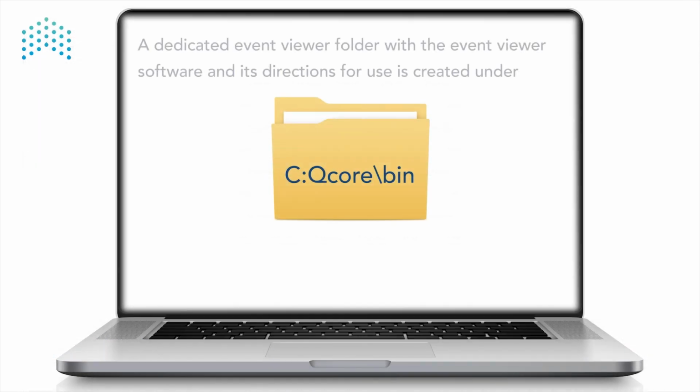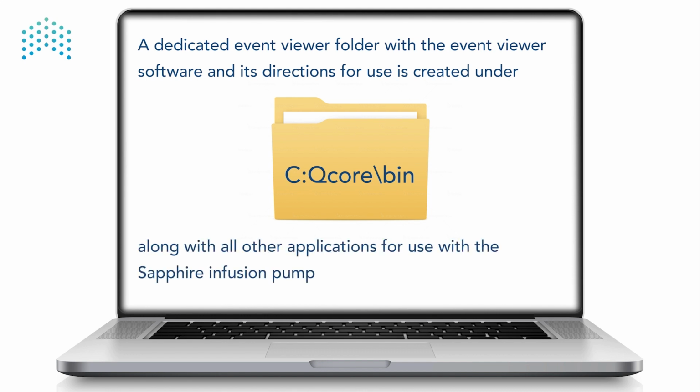A dedicated Event Viewer folder with the Event Viewer software and its directions for use is created under C:\QCore\bin, along with all other applications for use with the Sapphire infusion pump.